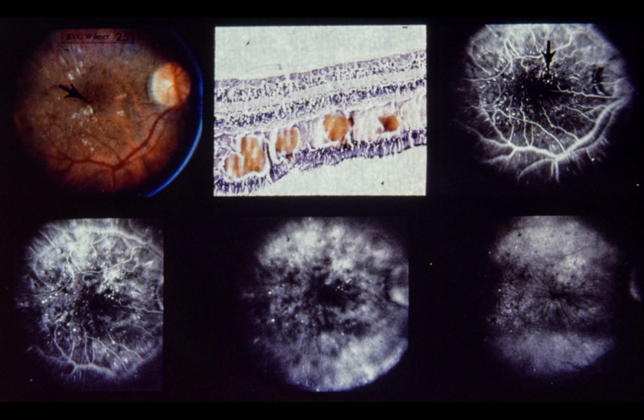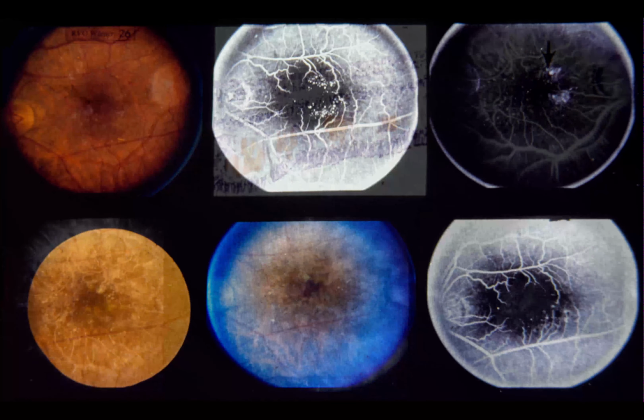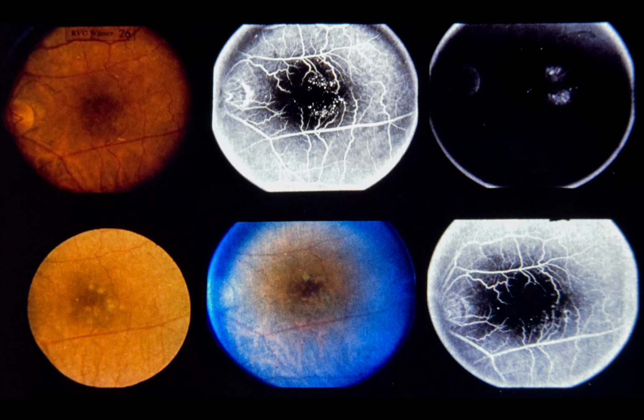The presence of well-developed cystoid maculopathy suggests that visual acuity may not return to 20/20 even when all leakage sites have been obliterated and all edema reabsorbed. On the other hand, control studies have shown that photocoagulation in such patients may reduce the rate of visual deterioration. Slide 26. Argon laser photocoagulation of simple diabetic macular edema.